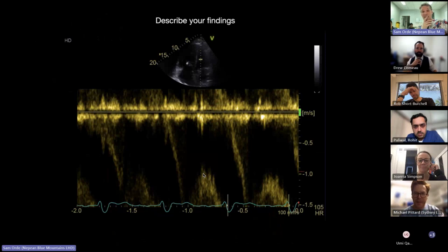And then this last one, yeah, you smashed. Again, it's just signs of mid-cavity obstruction with that late peaking jet. I think you said hypertrophy. I was getting a hypertrophic cardiomyopathy, the mid-ventricle variant of that, and signs of hypovolemia. And the last thing, just being pernickety, is the right ventricle is pretty big in this. Dilated, so it's not always hypovolemia. It can be because the left ventricle is being pushed over by a right ventricle, with maybe some mild LV underfilling or something like that.